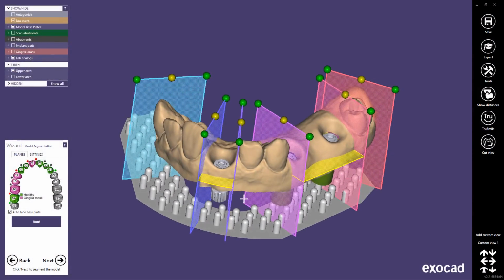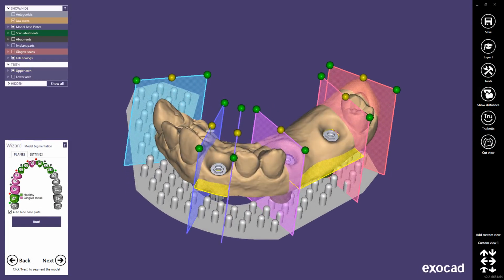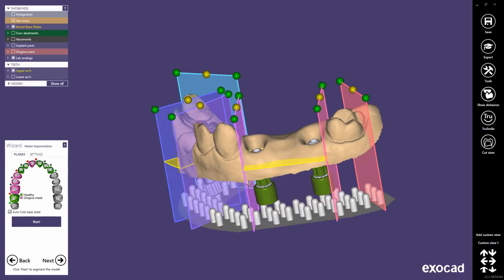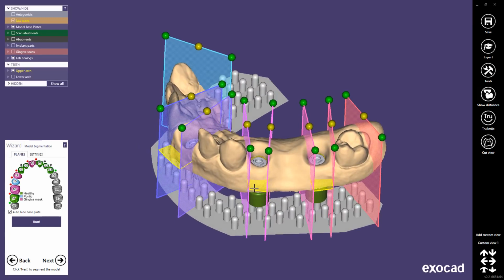The possibility to add gingival masks to designed models is also available for models with a base plate, such as the Baumann EVO system. In this case, it is not necessary to draw the margin for the gingiva. Instead, the software automatically generates a gingival mask for an individual segment of which the respective implant is located. Of course, you can toggle this on a per implant basis.